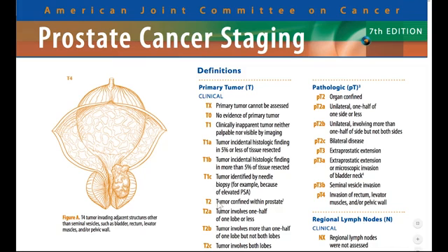Now T2, imaging plays a role because we're going to decide if the tumor is confined to the prostate or out of the prostate using certain visual methodologies. And we're going to hammer home those visual methodologies as we discussed in the beginning. T2, confined to the prostate.